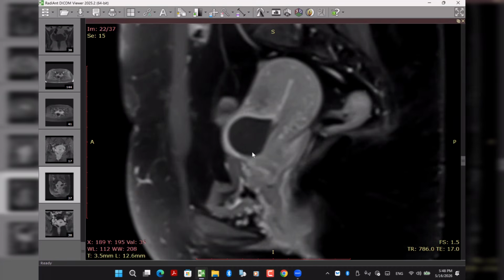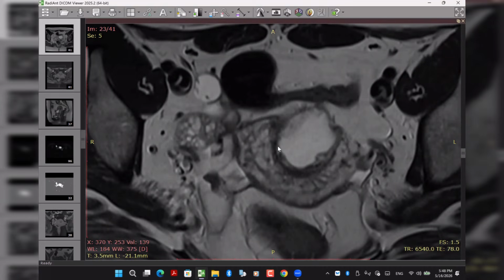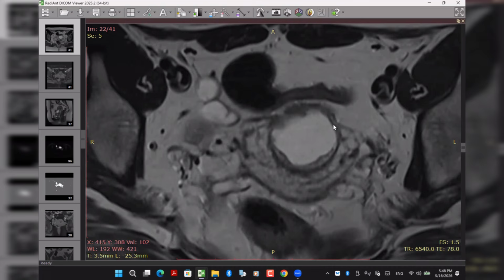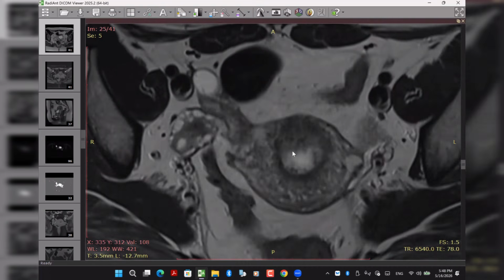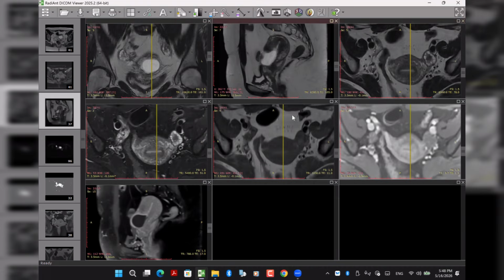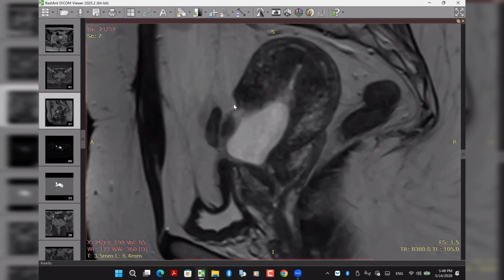And this is the axial. You told me you want to check the anterior myometrium. Yeah, it's very thin. So this is the cervical canal for this one. I'm thinking of a uterine rupture. And what is this signal? It's hypo or isointense, like a hemorrhage, bleeding.